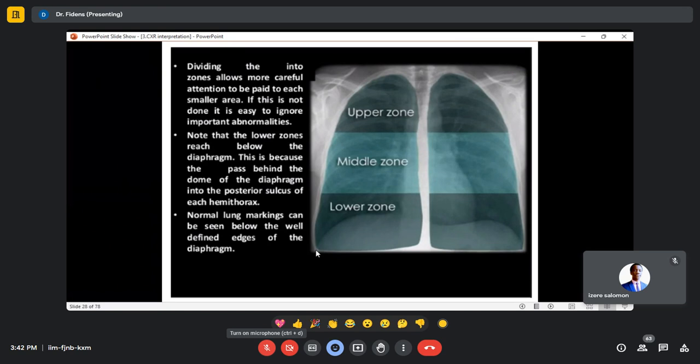And remember in the lungs, in the lung field, what you see is air and blood vessels. And remember, blood vessels should be very thin. They should have a smooth wall and oblique orientation.